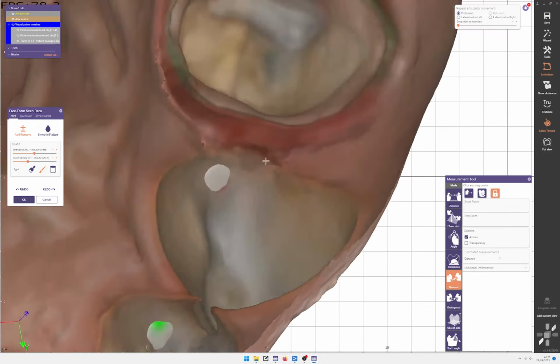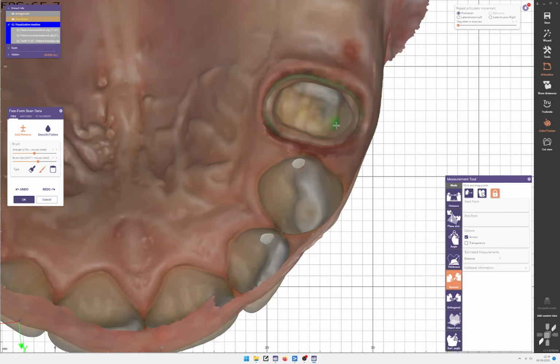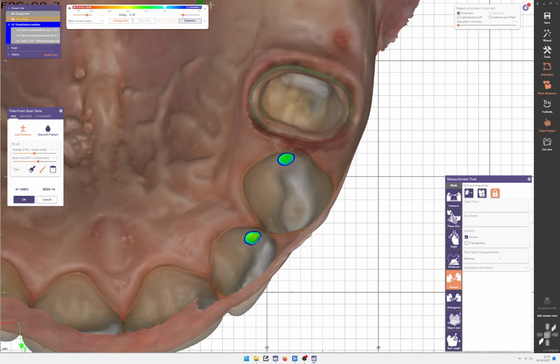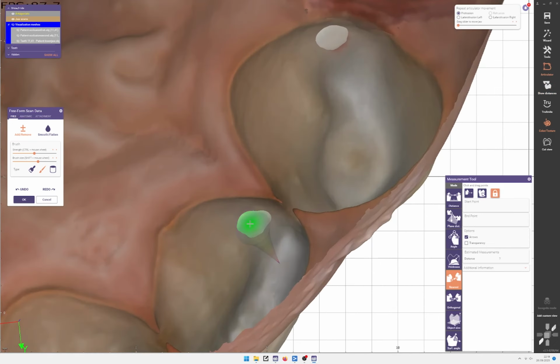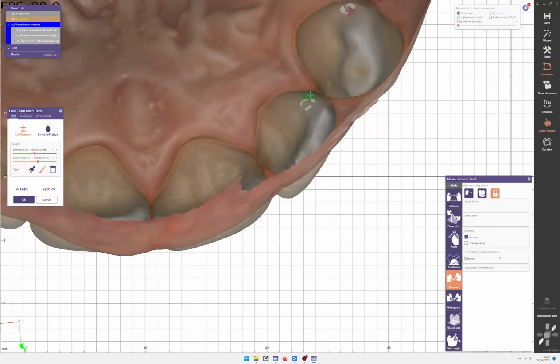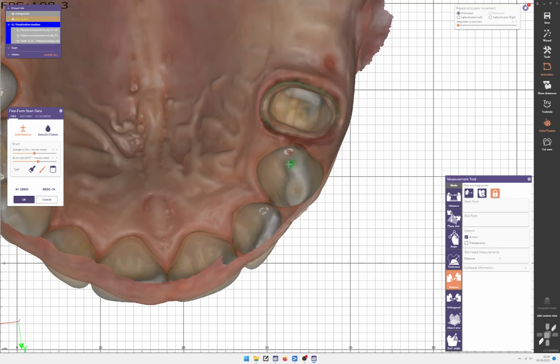So the parts that I'm having trouble with, you can turn on the show distances and include the healthy teeth here, or you can just see where it punches through, the lighter color, and just remove it manually. You don't even have to fully remove it, you have to mostly remove it, and then when you go again to the articulator, the algorithm will now work and it will produce a nice outcome.